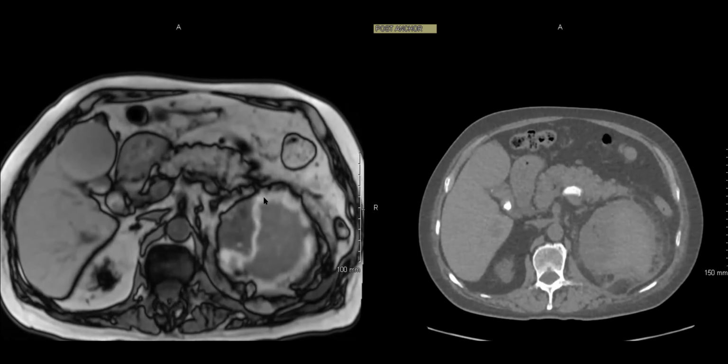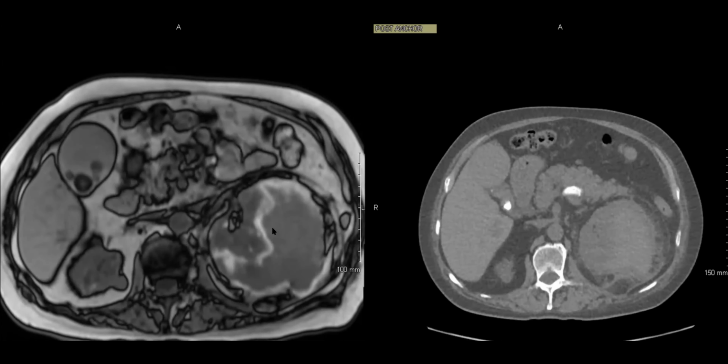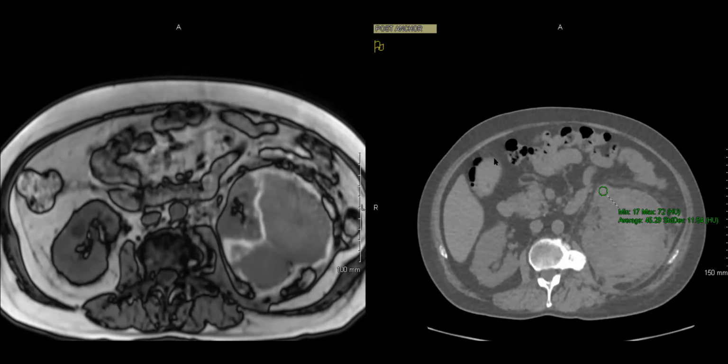Yeah, and I remember the patient presented with this tremendous perinephric hematoma, and they were looking to see if there was an underlying mass that was bleeding. We thought that maybe there's a ruptured cyst that bled.